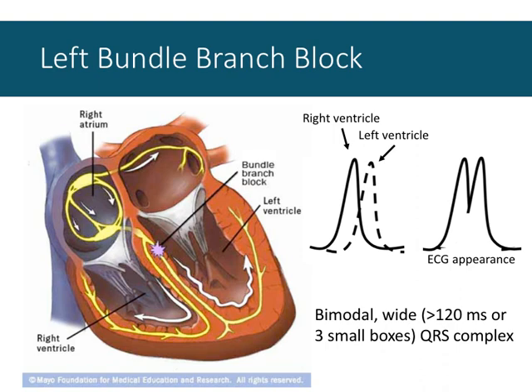If it were only this initial contraction, indicative of the right ventricle contracting where the bundle branches are intact, it would be a thin, quick contraction. But since we have this overlap and the delay in the signal, it's wider than we would expect. And I'll show you an example of that in 2 slides.